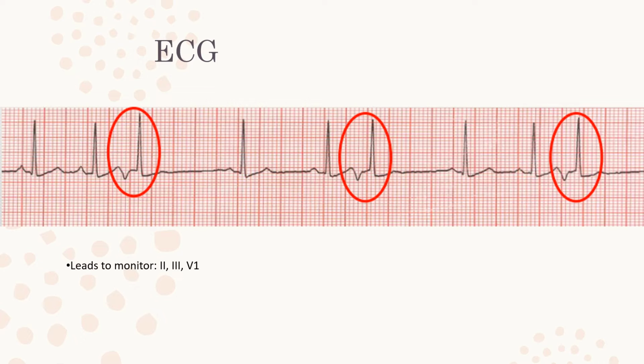If you look at the normal QRS here, the normal QRS has a P wave, normal QRS, T wave. Here's one, there's a normal one, here's another one with a good P wave. Okay, you can see those are all sinus beats, essentially, originating from the SA node. But what happens is that when we march out the QRSs, we have a complex circled in red here that comes in early. That means it's premature. It's an early beat that occurs before the next expected sinus beat.